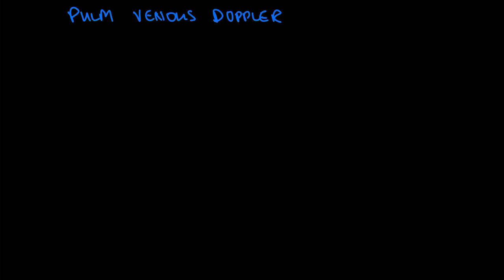Hi, this is Stephen, and in this video we will continue our discussion of parameters used in diastology, or how the heart fills with blood. And in this one we'll look at pulmonary vein Doppler tracings, a topic that can sometimes be a bit confusing. Let's do our best to tackle that.